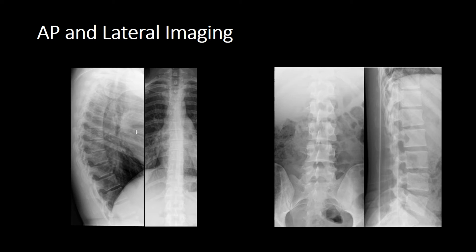Look at your spinous processes, checking your interspinous distance. Importantly, look at your transverse processes. You can get isolated fractures of the transverse process, and you won't appreciate these injuries unless you look for them. Look at your ribs. On your lumbar spine, look for your psoas shadows if you can see them. Obliteration of the psoas shadow may indicate a massive hemorrhage within the abdominal cavity.